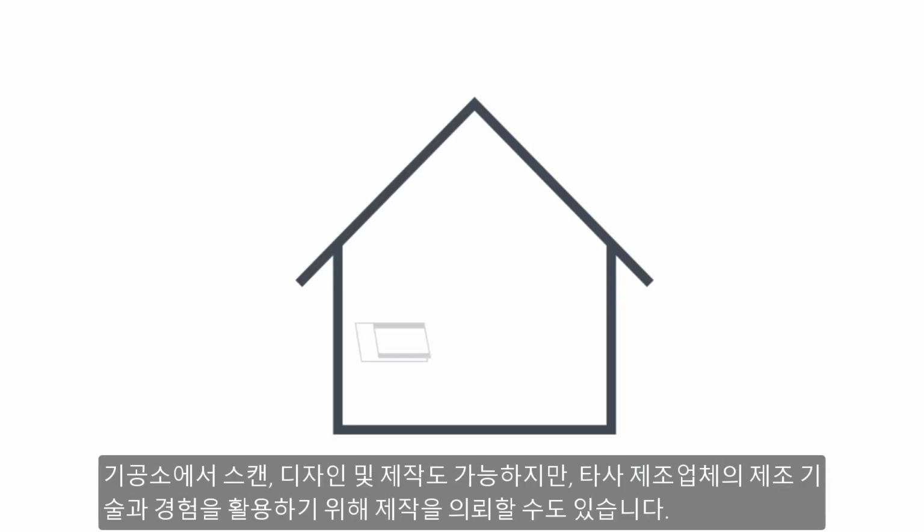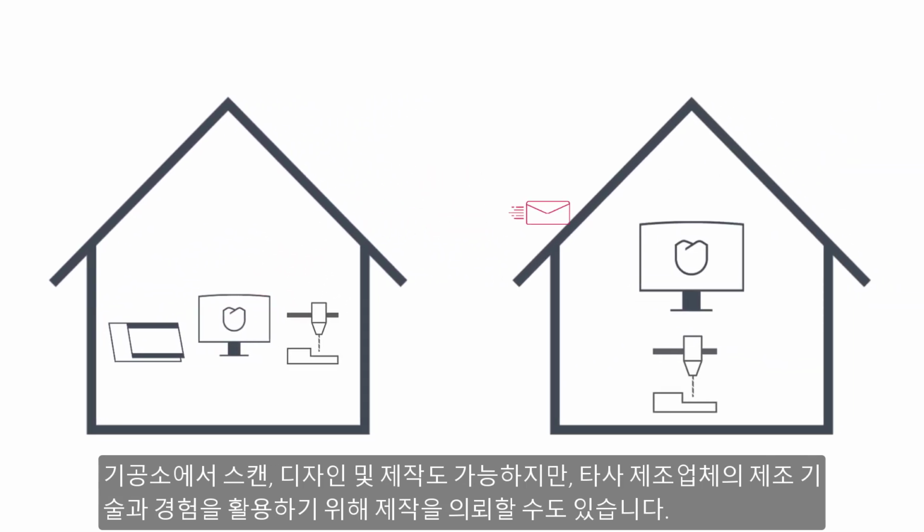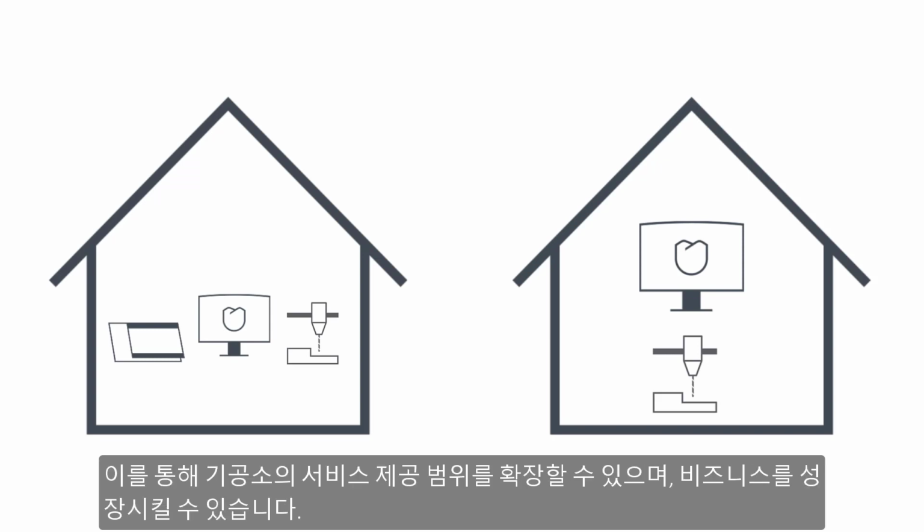You can still scan, design, and produce your orders. However, you can also send it out to third-party manufacturing centers to use its production technologies and experience. This gives you the possibility to extend your portfolio of products and the development of your business.